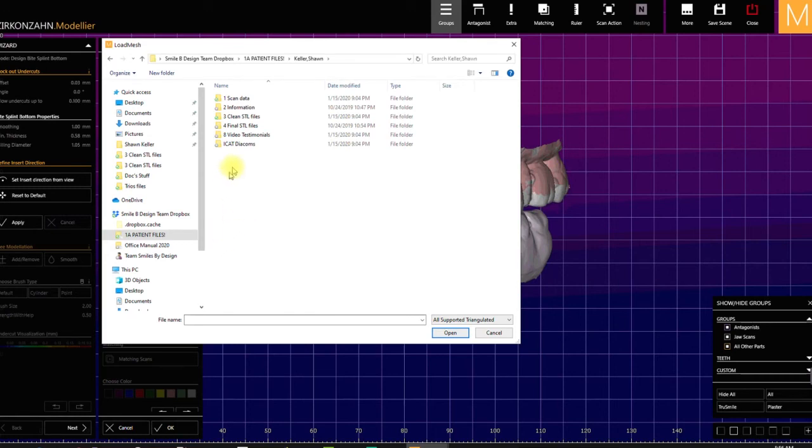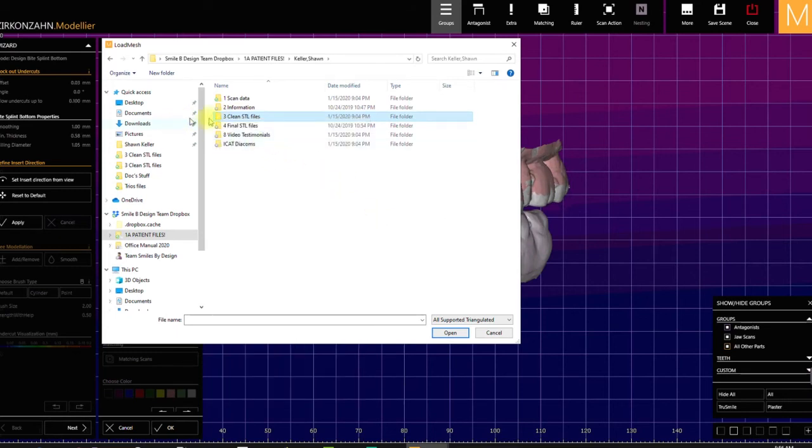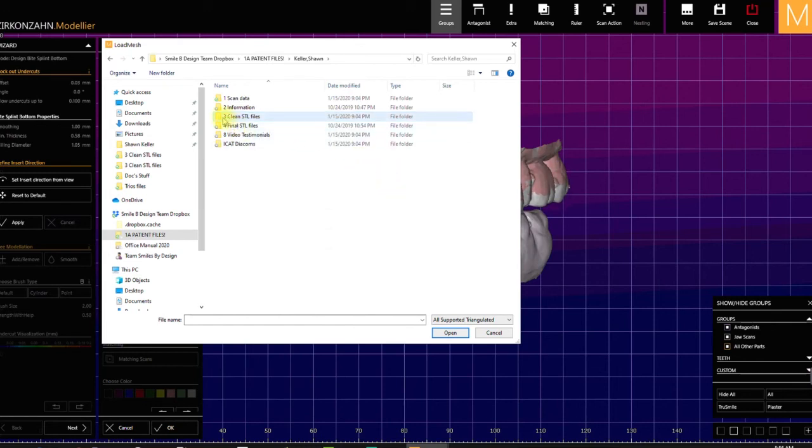Oh yeah, key point again. Don't ever download from files that don't have that little green arrow there. So local. So it probably won't work if you do that.